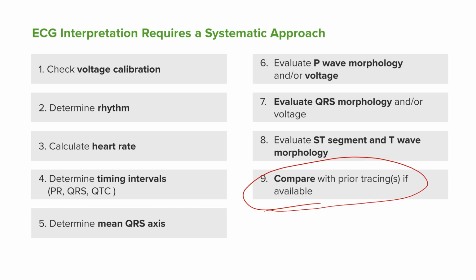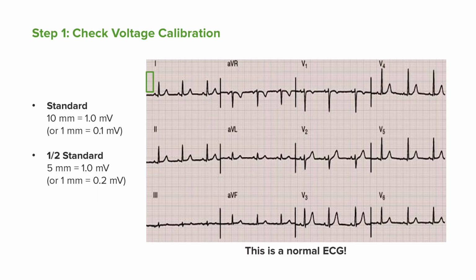So acute changes are much more important than chronic changes. If a patient has had ST elevation for the last 2, 3, 4 years, and every ECG is showing it, then it might be a normal finding. But if it was normal in the morning, and now it is showing ST elevation, even 1 mm is quite significant. So when we look at an ECG, we can see that each lead has its own representations. Somewhere the R wave is good, somewhere the P wave is good.